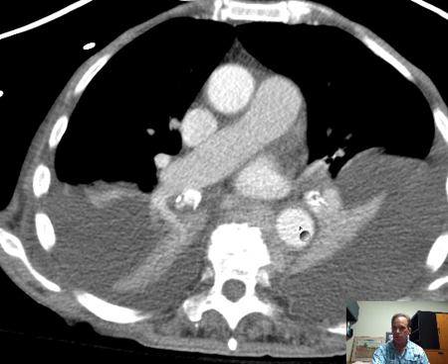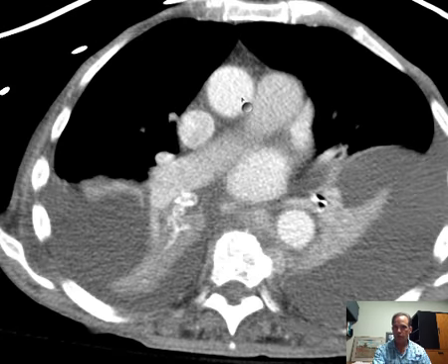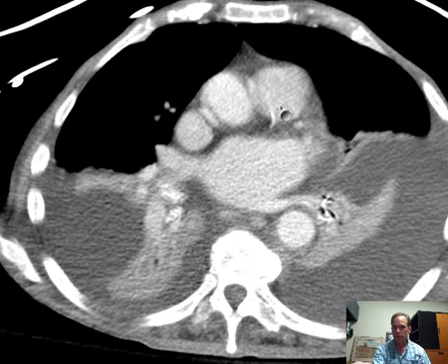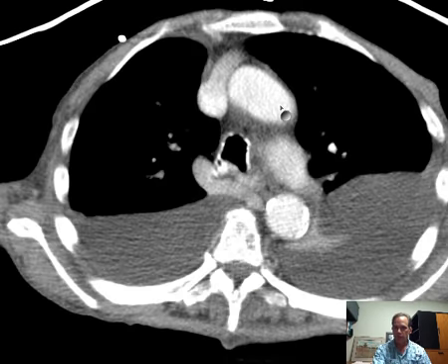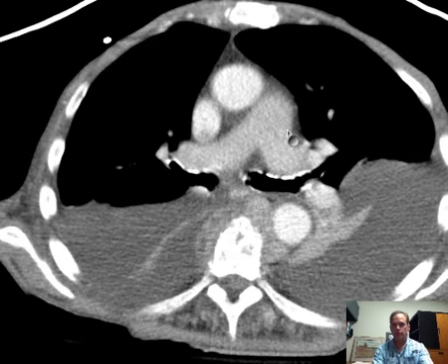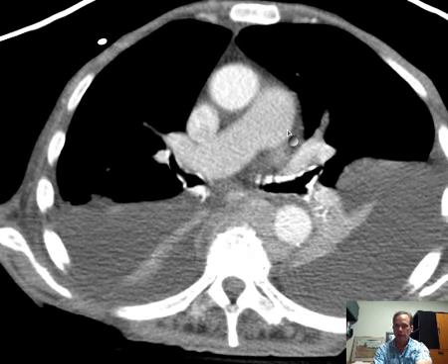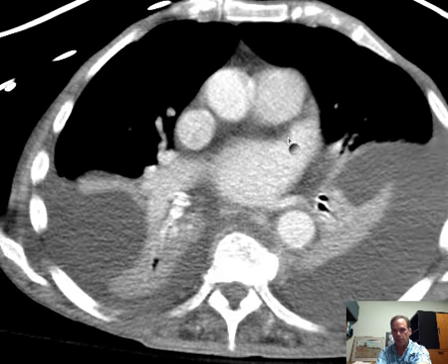And this again is because they arise embryologically from the same tissue, so things are in very close apposition to one another. The aorta and pulmonary artery, certainly on the left. And in development, there is a right-sided aorta, which becomes atretic.